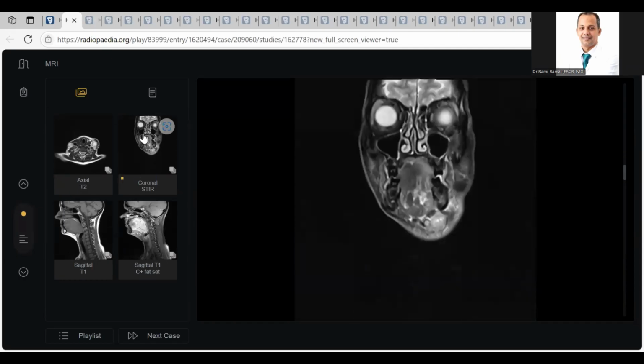Okay, sir. The time is over. Let's conclude, Dr. Omer, please. Okay, sir. So this is likely a case of carcinoma of the tongue with necrotic lymphadenopathy involving the right cervical chain. Excellent. What else? Something important to talk about, please.